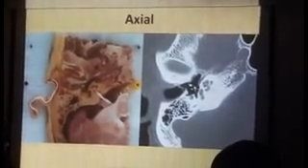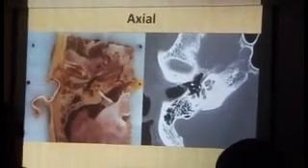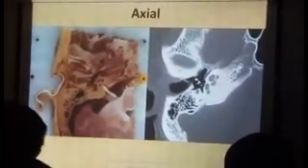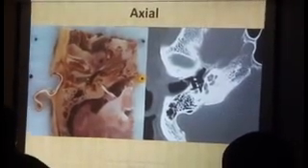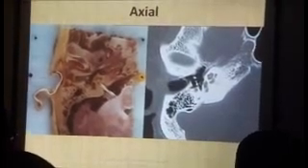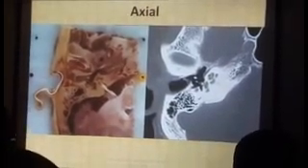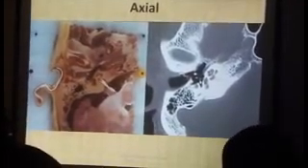You can faintly see the tensor tympani tendon. Can you see it on the screen? There's the contrast right there. Okay? So that's the tensor tympani tendon going towards the handle of the malleus. Right? That's the long process of the incus gradually getting converted into the lenticular process, turning, and not only that, we see the anterior crus, the posterior crus, and the head of the stapes.